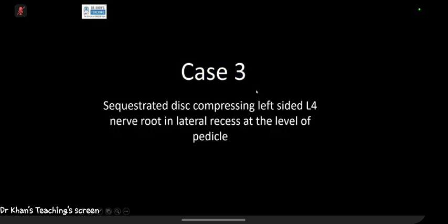Now you did very well. This is a sequestrated disc compressing the left-sided L4 nerve root. It is in the lateral recess. And which level is it? It is at the level of the pedicle.